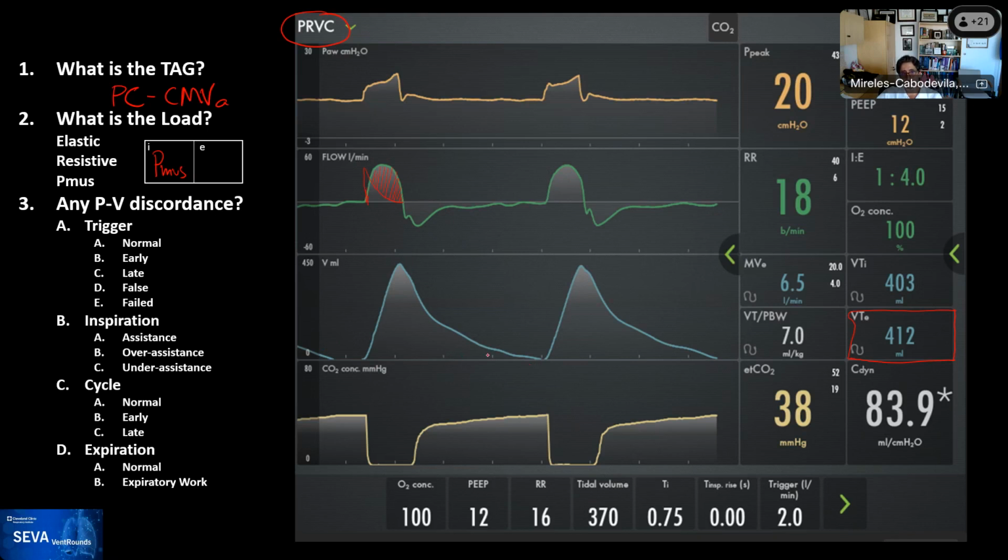It takes 1, 2, 3 seconds to get to baseline. And over here, it's at least 1, 2, and then there's this oscillation, so it becomes a little bit harder. The second is that these oscillations are identical from one breath to the other. If you notice this oscillation here, this approximation to baseline is identical to the next one and identical to the next one. So very similar, which makes me, I mean, could it be PMUS? Possible, but the way that the exponential decay is going down and with these oscillations, it makes me more sensitive to whether this is a cardiac oscillation involved there.